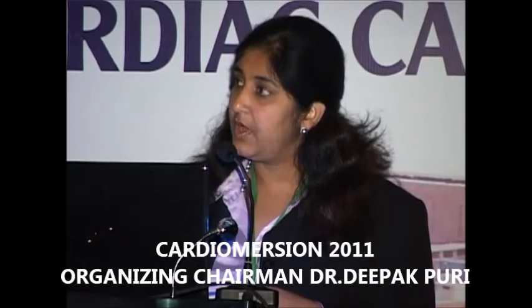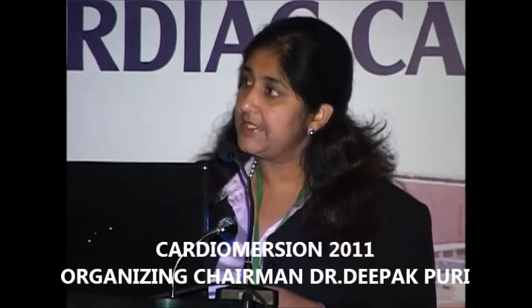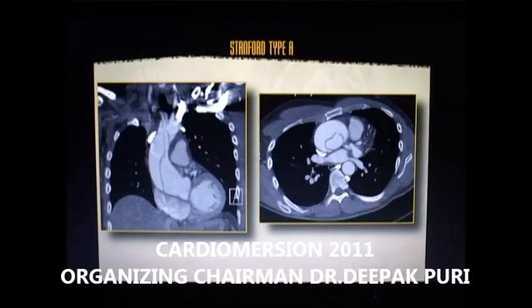This is an example of type A aortic dissection. This is the aortic root. This is a coronal reconstruction, which is demonstrating that the aortic root is dilated, and this is the dissection flap, which is also extending into the branch vessels. And this is the usual axial image that we are used to seeing.